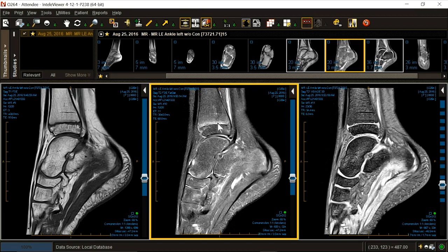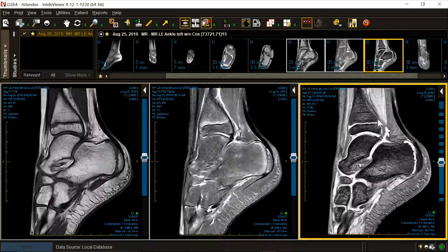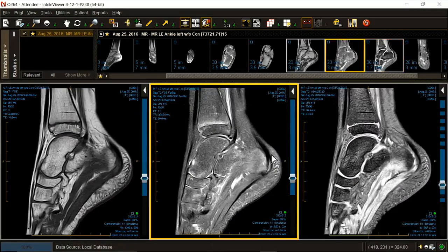What can you use as a concrete, quick, expedient, indirect sign of a real growth plate problem? The periosteum. Nobody has a growth plate injury without a little periosteal bleeding. She does not. That's normal cartilage. There's no bleeding going up underneath this black line in front or in back. That is a virtually 100% reliable sign for a Salter-Harris 1 or greater fracture. So we haven't answered the question. Or have we?